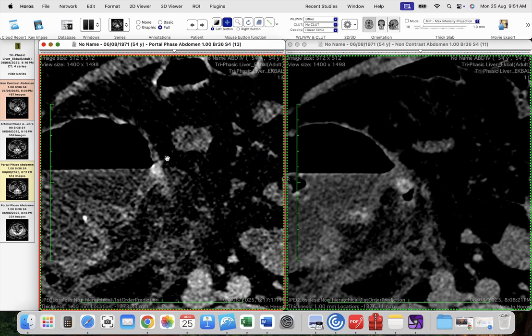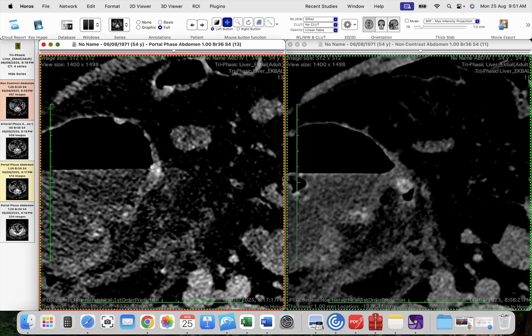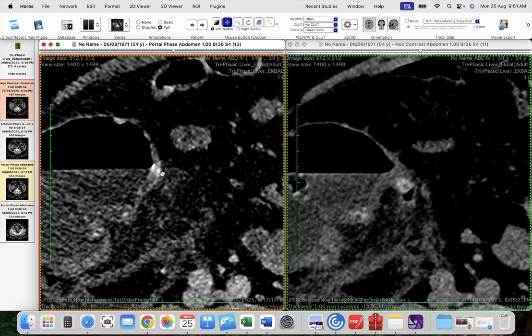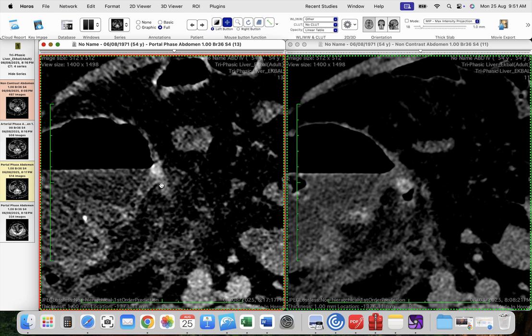Also, the post-operative care will be different between a patient who had an appendectomy and the other patient who had a right hemicolectomy. So you should raise the suspicion, because this is a small nodule. I'm not sure truly if it is a focal nodule or could be an artifact or something, because it's a small one, intramural.